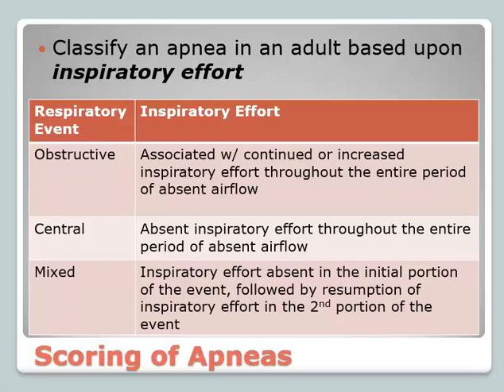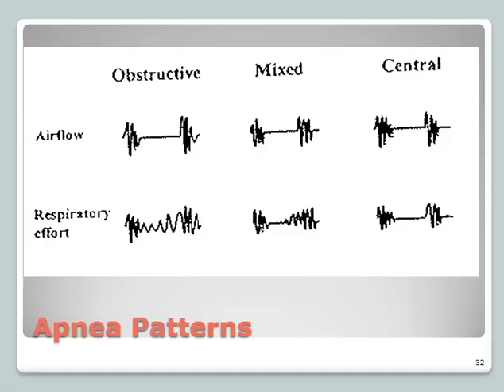So where's the picture? I have pictures, and I'll come back. There it is. I don't know why I have it all the way to the end. No airflow, continued effort. No airflow, no effort. Mixed is no airflow. So you see how if we were to cover up the bottom, the apneas look identical throughout. Apneas will look identical. You have to look at your effort to figure out the type of apnea.